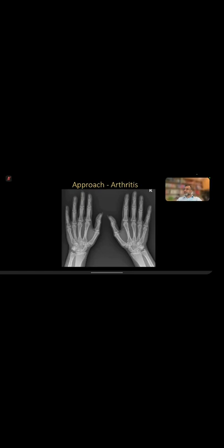So if you're looking for erosions on the hand X-ray, when you're doing a ball catcher view, you can see these erosions better as compared to the normal dorsal palmar X-ray or PA view or AP view, whatever you want to call it. Okay. So always look on the radial aspect. Ulnar side irregularity can be normal. Ulnar, normal. Okay. Remember normal with the N.